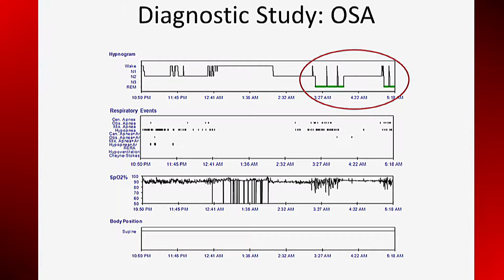The final stage of the study demonstrates REM sleep. The REM sleep is fragmented, but not as bad as sleep was fragmented during the first stage. Non-REM sleep proceeds without interruption.